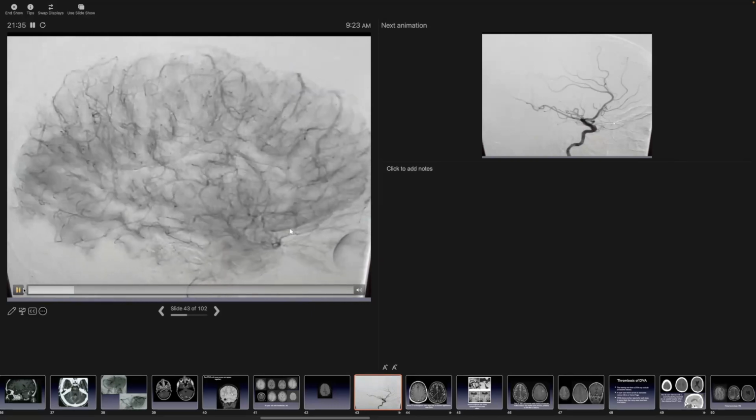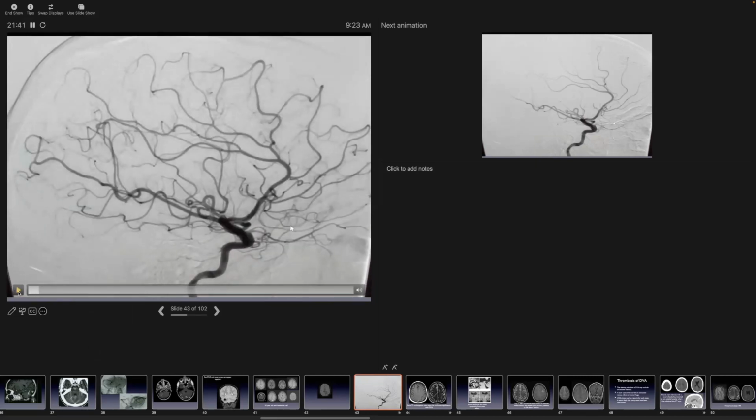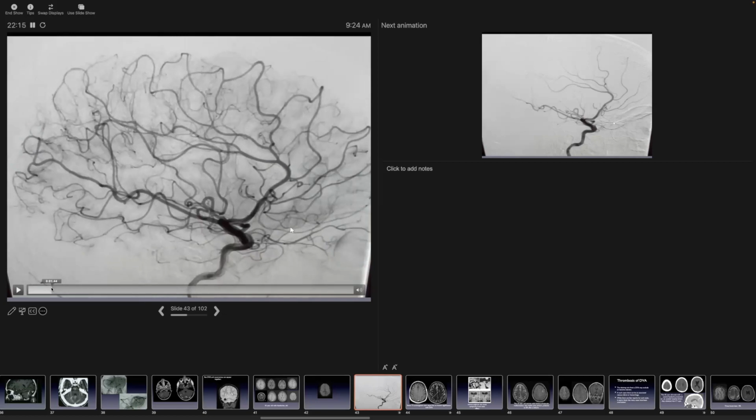And as we look at the angiogram, if you think about how you would go about doing this angiogram, for those of you that read angiography or do angiography, remember that the goal in an angiogram in a case like this is to deliver the contrast in a compact bolus so that you have clearly defined vascular phases. So you can define the early arterial, the mid arterial, the late arterial, the capillary, the early venous. You should be able to see all of those phases. And if you do a hand injection, I think there's a greater likelihood that you will slur the contrast injection and may be misled sometimes in terms of establishing the different vascular phases.